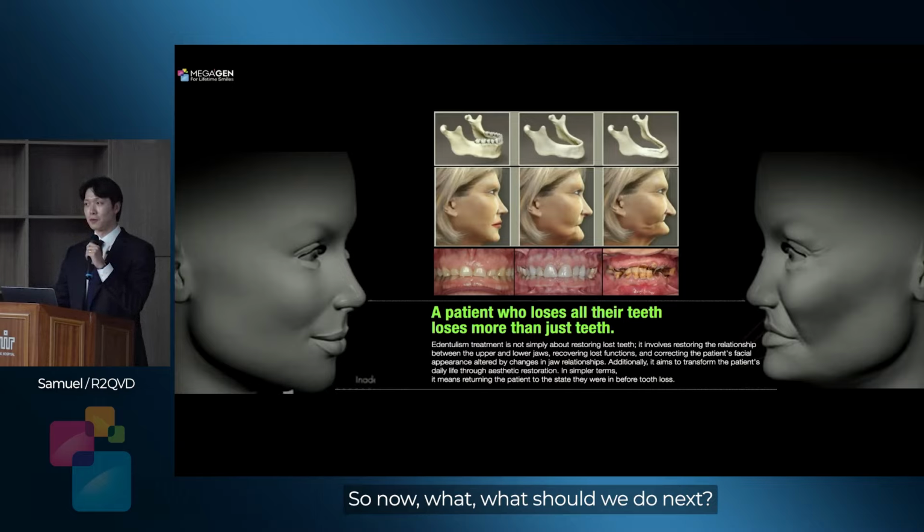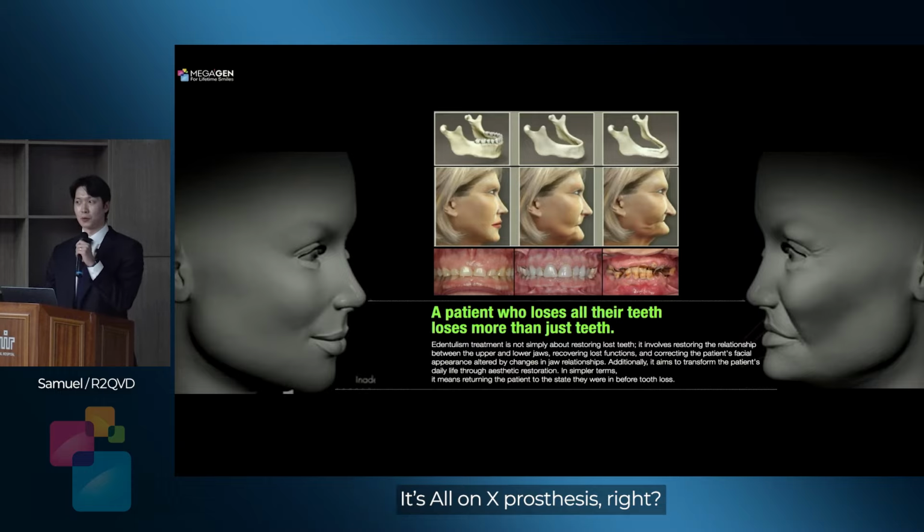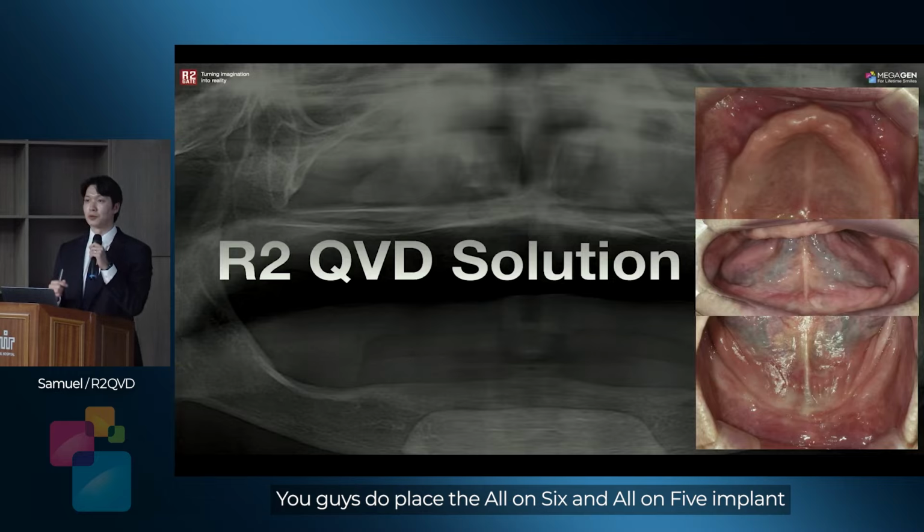So now, what should be next? I think it's the All-on-X prosthesis, right? So we did the hands-on, right? You guys placed the All-on-6 and All-on-5 implants.